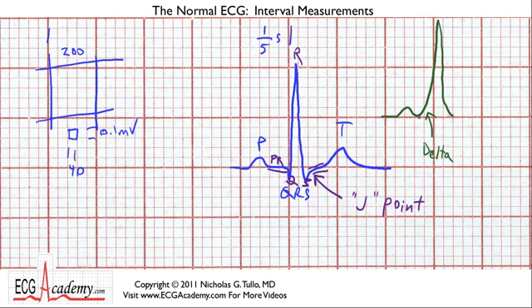What this does is it causes the QRS complex to widen and start early, and the PR interval is almost non-existent in those patients. Sometimes you'll have inverted T waves in these patients. And there's one last wave that I want to mention because it is considered part of the QRS complex, and that's known as an epsilon wave.